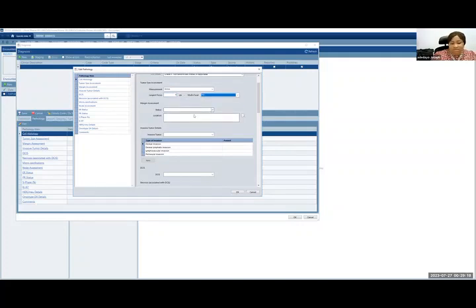What about the margin status? Did they tell us that it's negative? Did they tell us that it is positive? Did they say it is focally positive or positive in multiple spots? Or they just said positive and they didn't tell us exactly what? So in that case, it will be positive, not otherwise specified. Or is it unknown? The margin status was not reported, so we don't know, and then it is unknown.